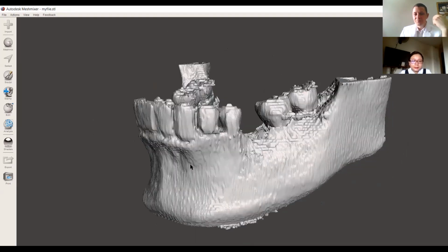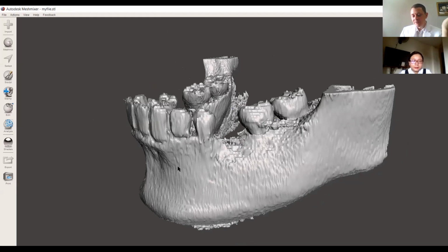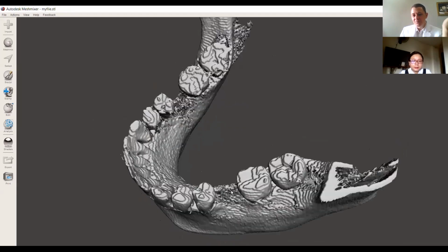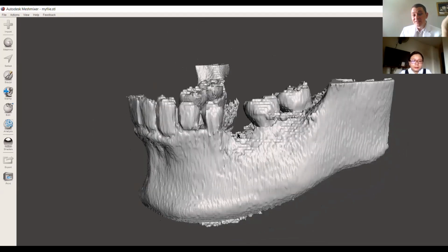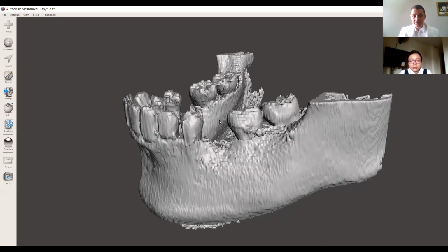So you see, if you make 3 and 4, it's a lot blocky. But let's say, for example, it's for an implant, and you want to check what size you need. You don't care if the definition is not very good. Because you have to understand the definition is low, but only in the thickness of the layer. The definition inside one layer did not change. So if you want to calculate, for example, the distance between these two teeth, it will be the correct one.